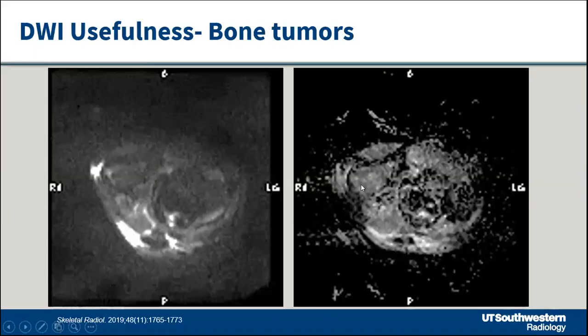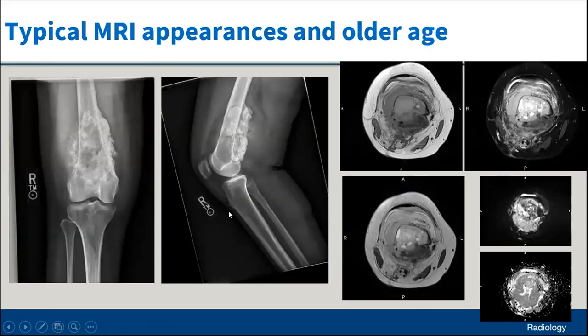And if you look at DWI and ADC, these will be dark tumors. That's something published by my colleague, Dr. Oganis, who may be online. Basically, he published on giant cell tumors of bone and soft tissues. They all have low ADC values, but to start with, they are lowish also on the DWI. So that's a good thing that can help you with giant cell tumors.